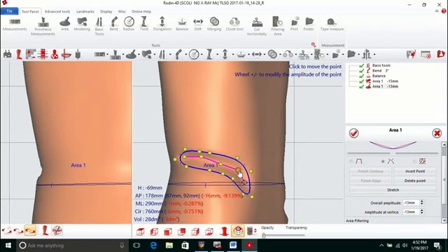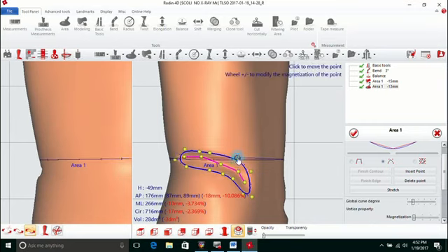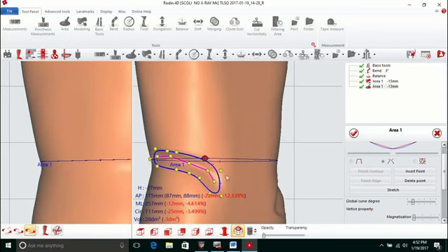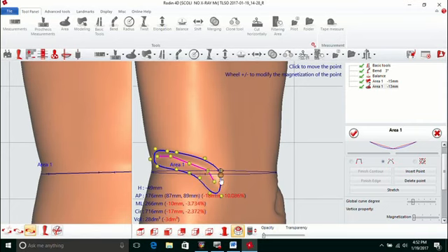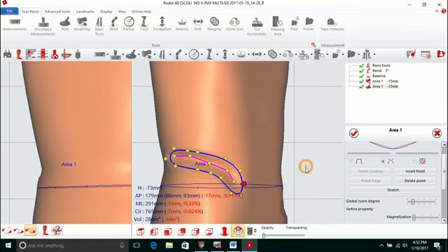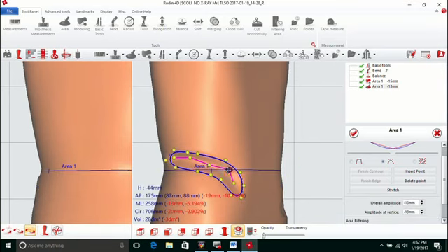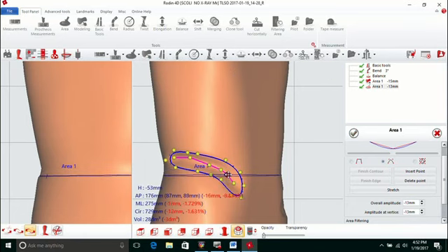Now with the summits, if I left click, it highlights. If I click down again, you get the 4 arrows. You're able to manipulate and relocate these summits. That's one of the things I like about this tool. It gives you more control of your modification. Same thing with the outside. Double left click, hold down. If I want to increase the amount of summits, single left click, right click, drop down, add vertex. Now you have another. You can elongate, you can make tighter radiuses, and then same thing with the pink line. Right click, add, able to add the summits.